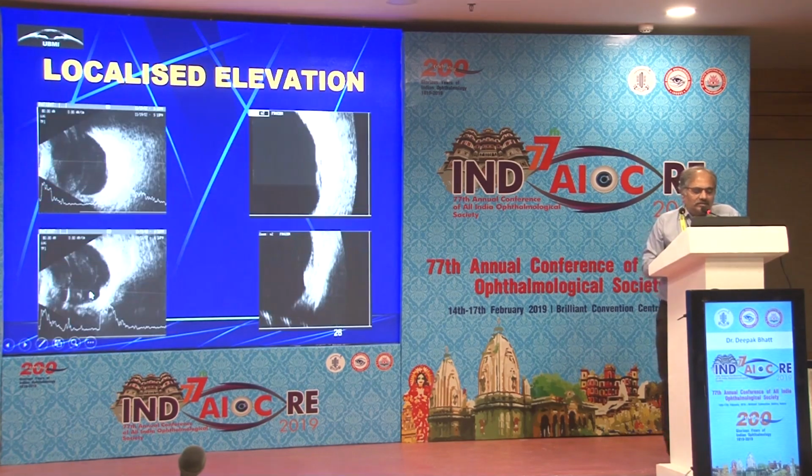What we require is in just a few situations. Look at these two patients. There is a small elevated lesion over the retina and choroid, near the posterior pole. They both look very similar on ultrasound. Is this a mass or not was a question which was raised earlier.